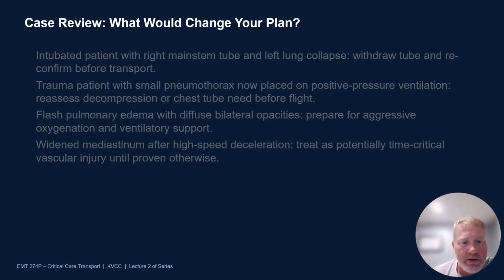Flash pulmonary edema is very common, with diffuse bilateral opacities. Usually, those folks need some serious positive pressure in the form of PEEP and a lot of oxygen, to overcome all of the VQ mismatch that pulmonary edema and other fluid issues can cause.